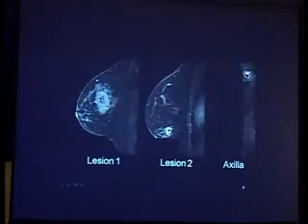And this is her MRI finding. Type of enhancement, lesion 1, which is the bigger one. I'm going to say rim-ish. Okay. Maybe heterogeneous, some of you may say, and that's a clip, of course. Lesion 2. What am I showing you here? Lymph node with a clip. Okay. So these are our MRI images showing enhancing mass.